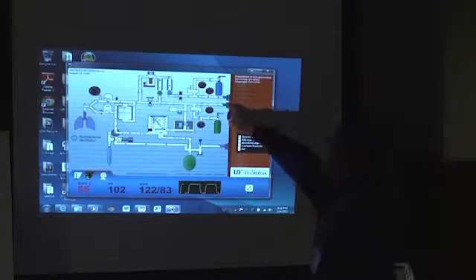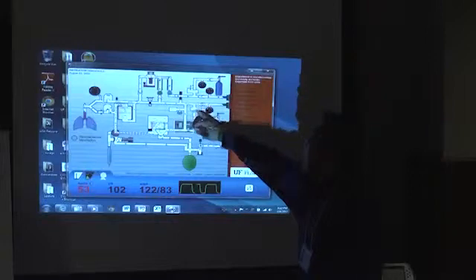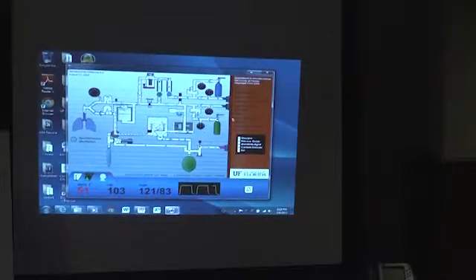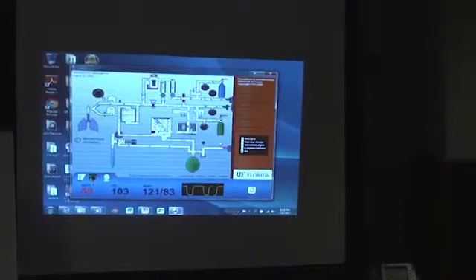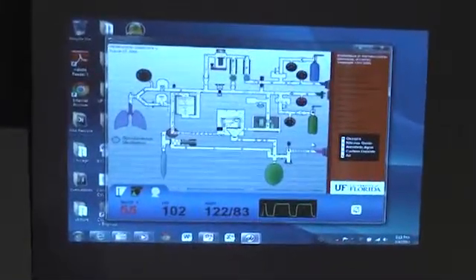50, plus or minus 5. So it could be 45 to 55. So at least it's 45, and here it's 40. So what's going to happen? The gas won't flow because 45 is stronger than 40. So unless you do what she recommended, removing the pipeline, the oxygen from the cylinder can't start flowing. Now it can, and now you save your patient. A lot of people miss that last part, removing the pipeline.